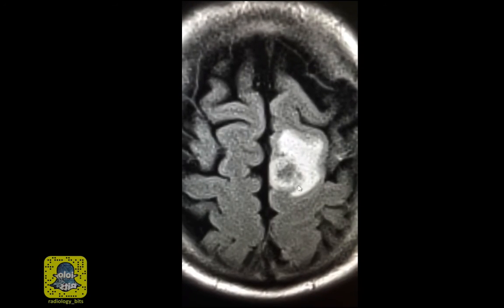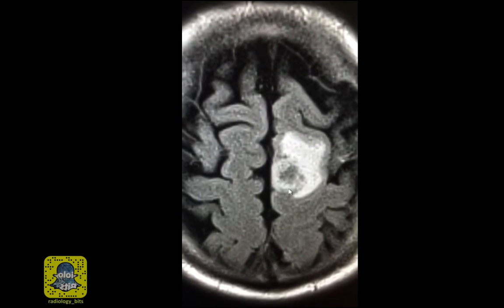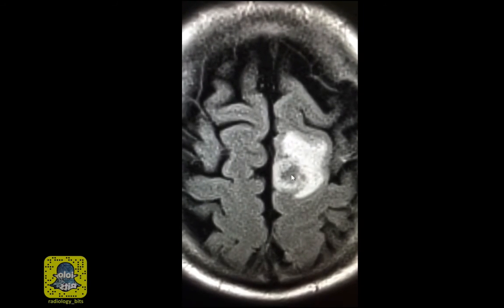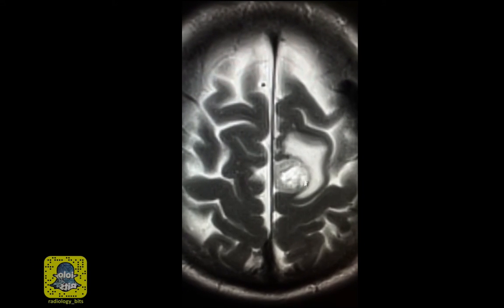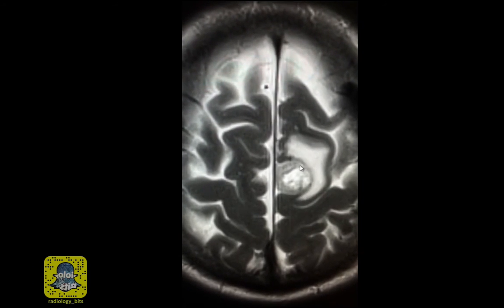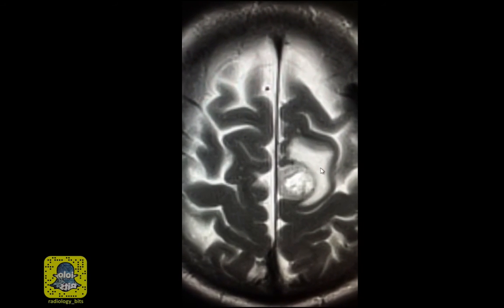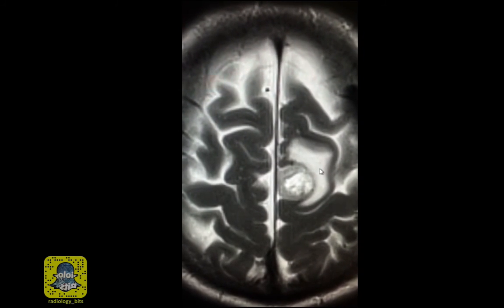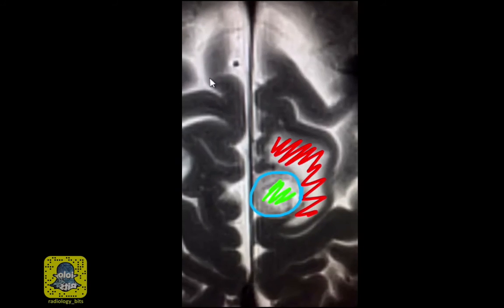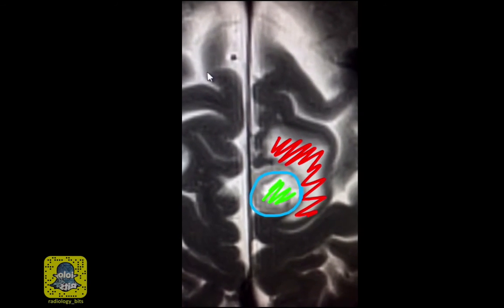The lesion itself has a relatively thick capsule on T1 that's a bit bright with a center that's very dark. And this is the appearance of the abnormality on T2. There's the edema outside and the rounded lesion that has a capsule and an internal area that's bright. So putting all things together, the thick outside capsule is soft tissue and the center is probably necrotic. So peripheral edema in red, soft tissue capsule in blue, and necrotic center in green.